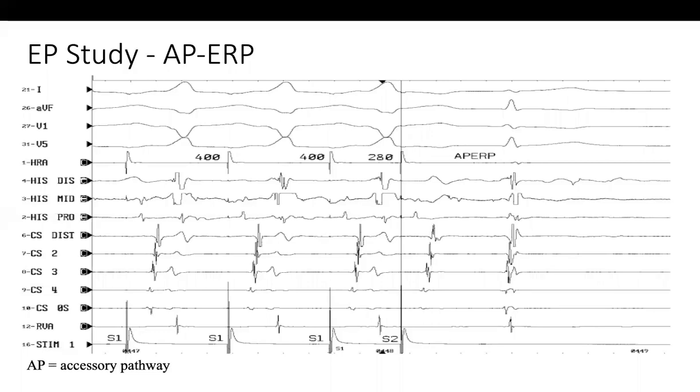In this situation, you might need a 12 lead ECG to compare different QRS. But if you see lead one, the lateral one, and it is really very wide, then you are talking about a more lateral position rather than a septal position. The intracardiac will help you a little about this.